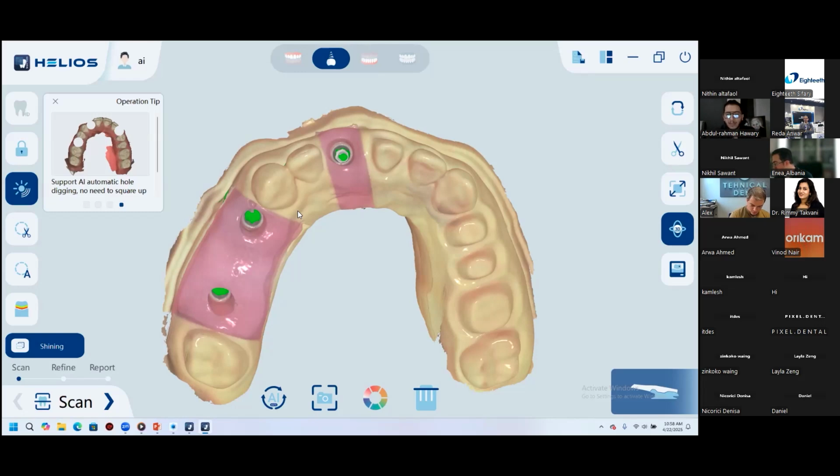To automatically align the bite of an edentulous scan without placing any appliance, no, it will not automatically detect it if it's completely edentulous. You have to place an appliance, either a bite block, a temporary denture, or temporary restorations placed over an implant. You have to give the scanner a reference to actually detect the bite.